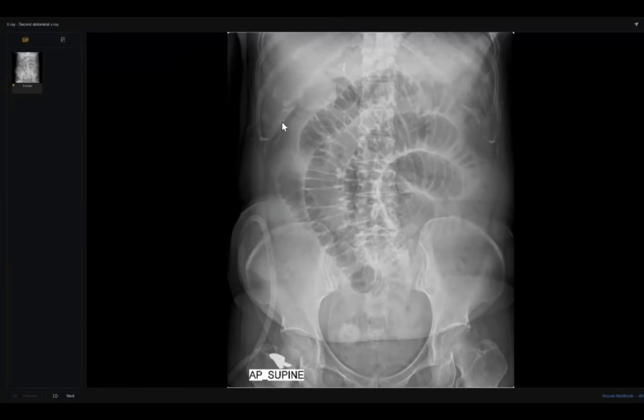There is a tube which is external on the right side of the film. I am looking for the hernial orifices which are visualized. So on this visualized X-ray, I cannot appreciate any bowel loop or any lucency below the pubic symphysis.